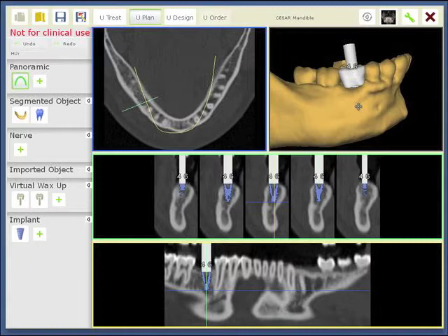and secure position. To do this, we need to overlay a plaster cast over the existing CT scan image because of some scattered images, because of crown and bridges, metal fillings and all that. We have some scattered images and the plaster cast will be much more accurate.